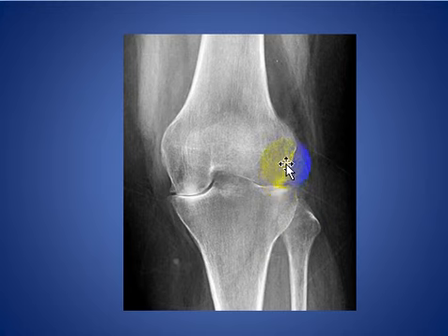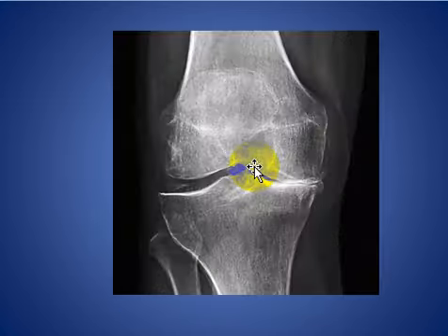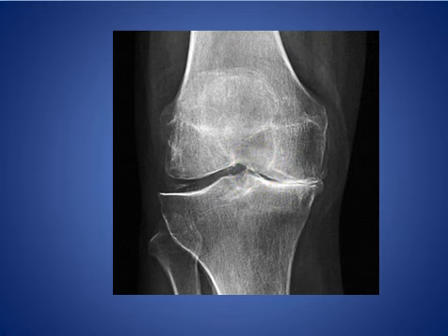Here, AP knee joint, we see bone is osteoporotic, and we see almost total loss of the joint space between the femur and the tibia, and this is the case of long-standing rheumatoid arthritis. Here, patient with osteoarthritis, and we see the medial compartment of the knee joint is narrowed with some sclerosis, osteophytosis, and with minimal deformity.